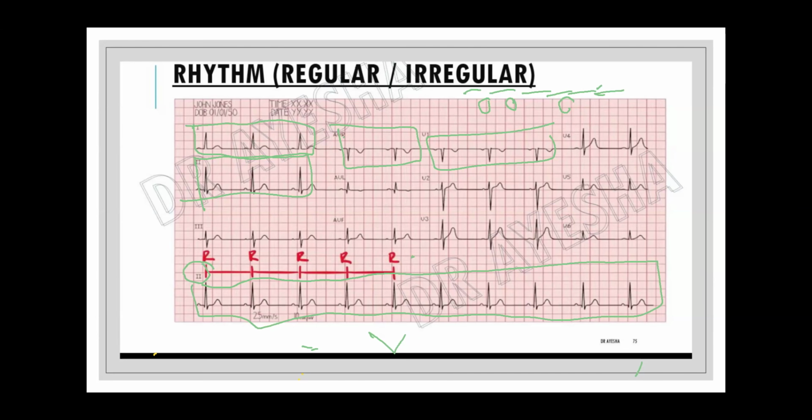You cannot. Sometimes the rhythm has a problem later on, or a problem comes very late, and beats are missed. So if you look at only 2-3 complexes, you will never get a clear picture. That is why you should see the bottom of your ECG, whatever the lead is over here. It does not matter. These are called long leads and most of the time it is lead 2.